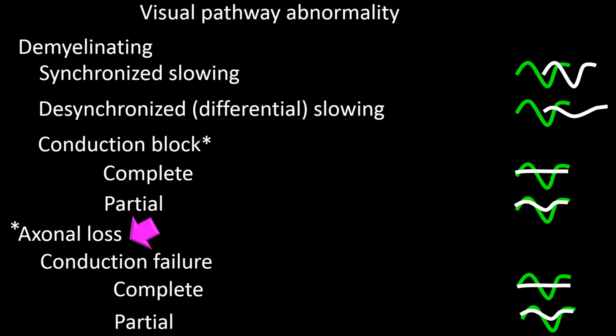In real life, we see complete conduction failure, which would produce no potential, or partial conduction failure that would produce a small P100 with no delay.